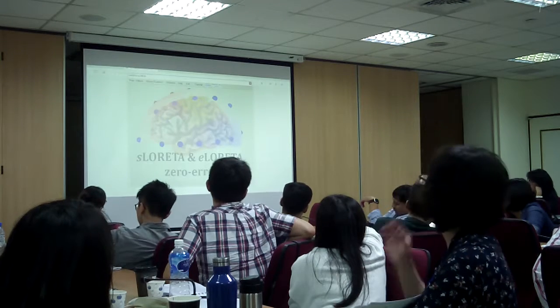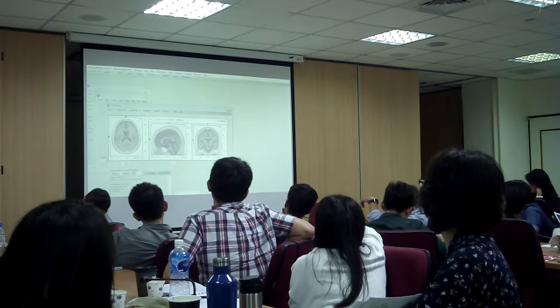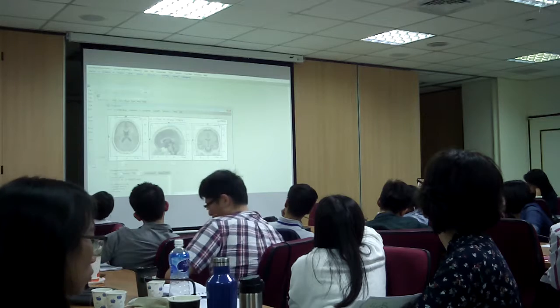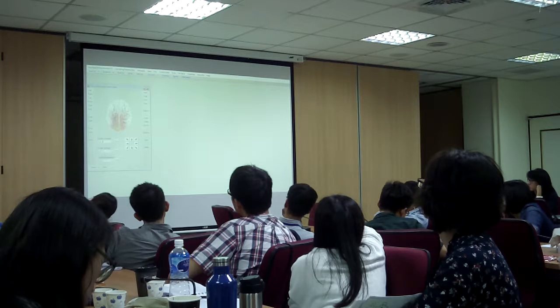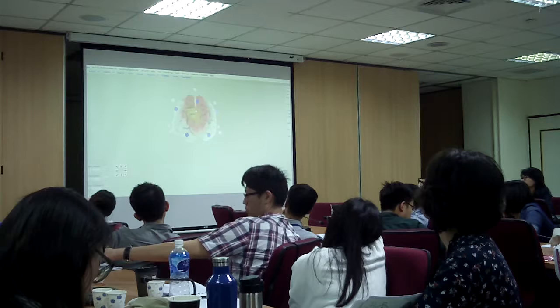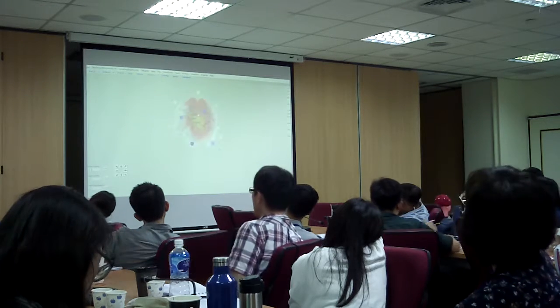And if we go to Viewer Explorer, we're going to go to Jobs and Notes Selected. We're going to go yes, and we're going to do the same thing. So we have the activation of the Brodmann areas, and here we have a region of interest. So we have a hypocoherent occipital cortex.